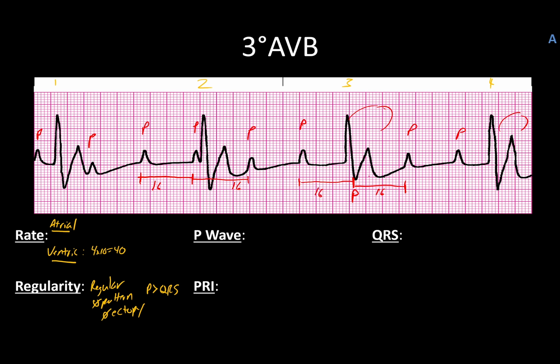So I've got a P wave hiding here, and if I do the same right here, that P wave is somewhere in this zone right around here. So I do have 2 additional, so that's 1, 2, 3, 4, 5, 6, 7, 8, 9, 10 P waves.